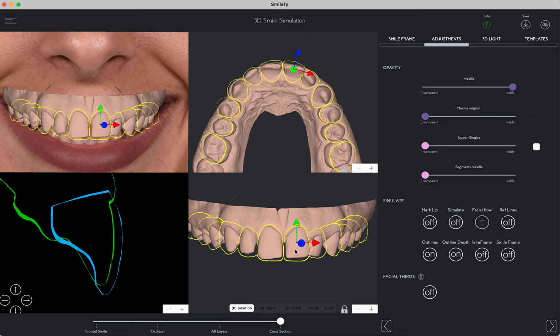The occlusal curve is perfectly redesigned with the centrals. I see what I can do regarding the position, and we know now because here we have our design tooth closer to the buccal surface of the patient as here. Now we analyze and we see actually that this tooth is in the wrong rotation, angulation than the right central.